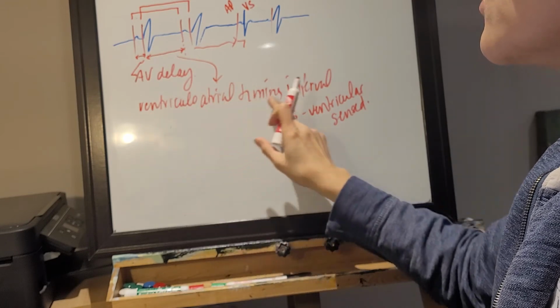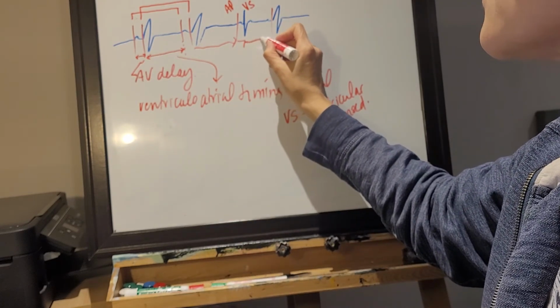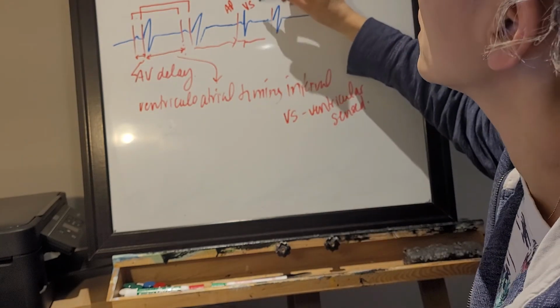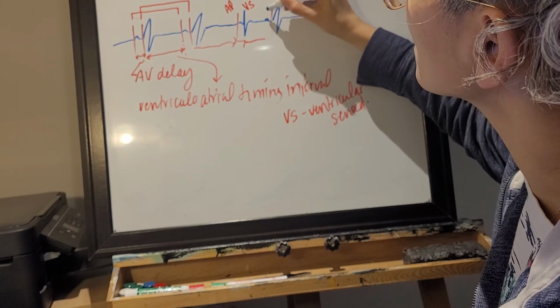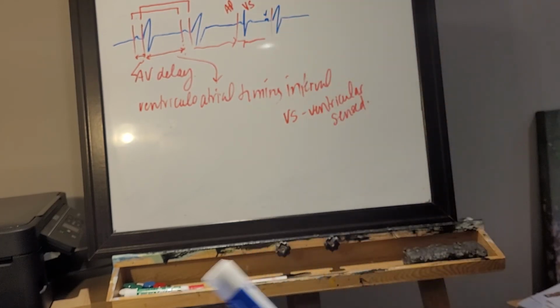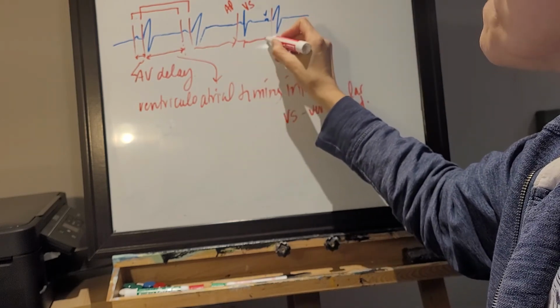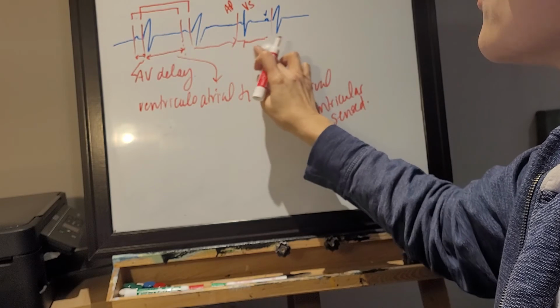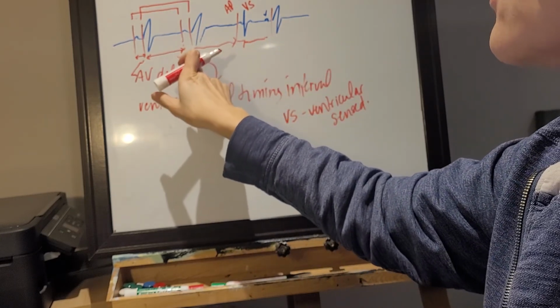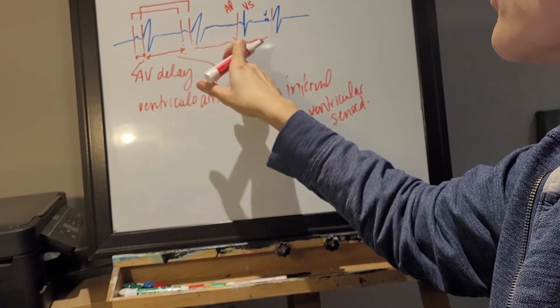Okay? And then again, your pacemaker starts counting. The ventricular atrial timing interval starts counting, and it's looking for intrinsic activity. I don't know if it's coming across in the video, but there's a little P wave here. And notice that there's no pacer artifact before it. I've tried to purposely draw that it happens here, and it's a shorter time than the distance between the last cycles, so the second and the third ventricular atrial timing interval.